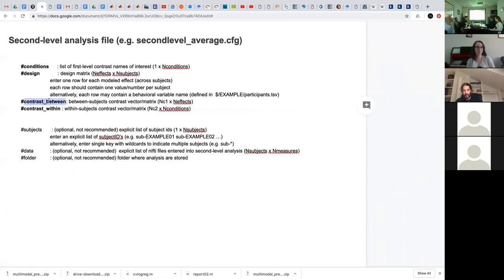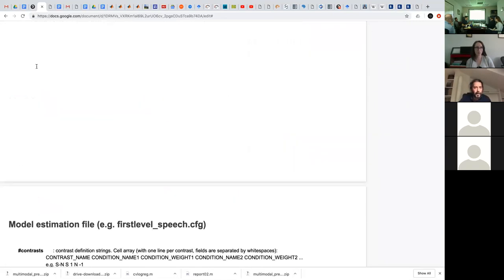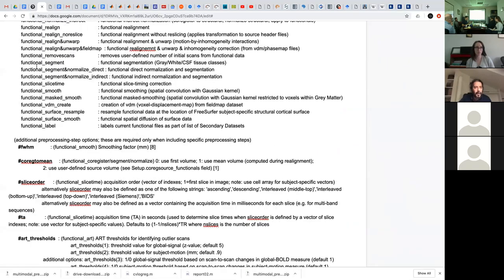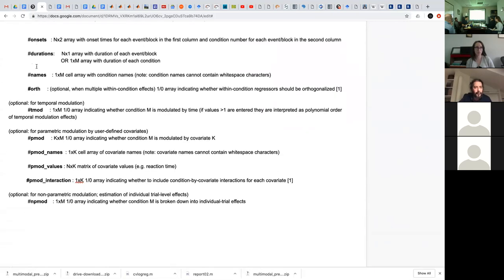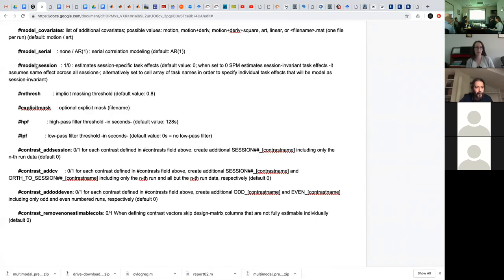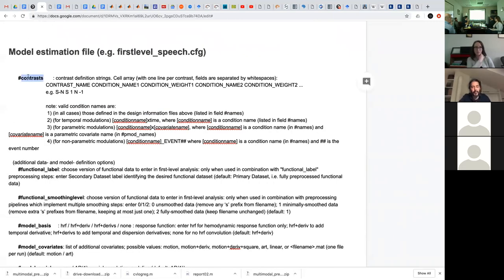This is perfectly fine. I mean, what I don't want to confuse is what we call, remember here where you specify the first level model, you can enter actually, where was it? I don't have an example here. Where was it? I should have it here. I think the examples are below. The whole list. Yeah, this contrast basically.